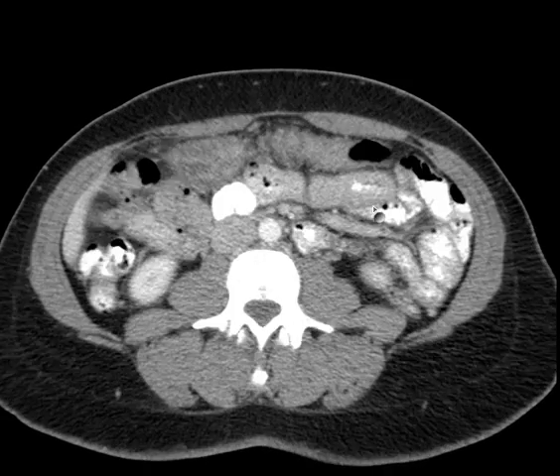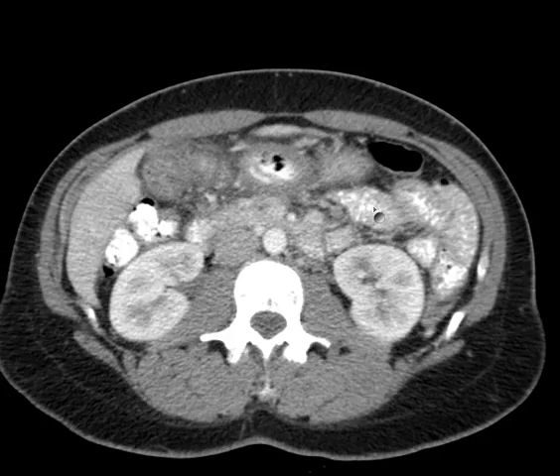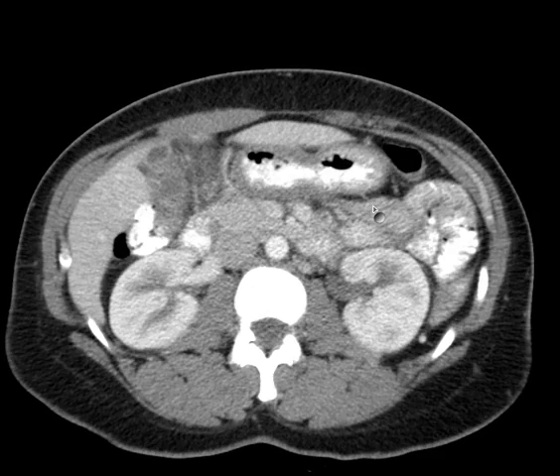Well, that's good if you see that, because I think just seeing an abnormality is critical. Being able to describe it and what anatomy is affected is the next step. And really, those are the two big steps. Third step, differential diagnosis.